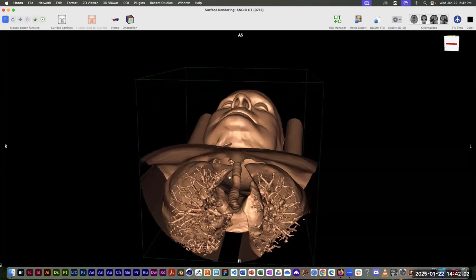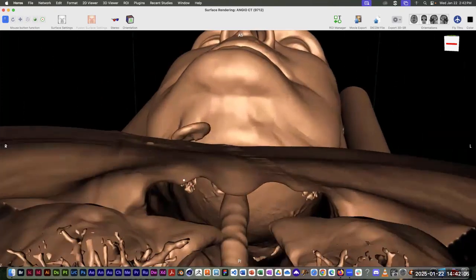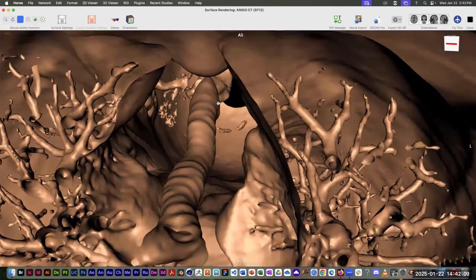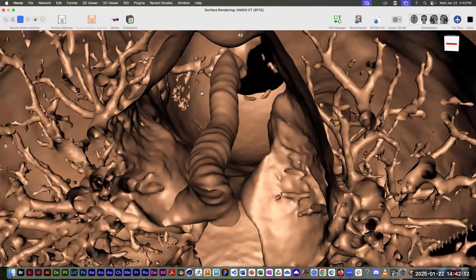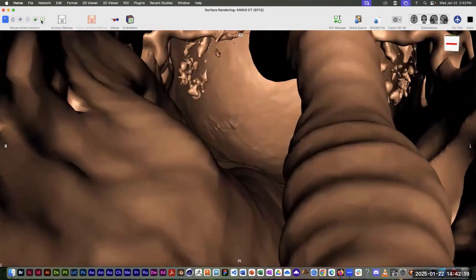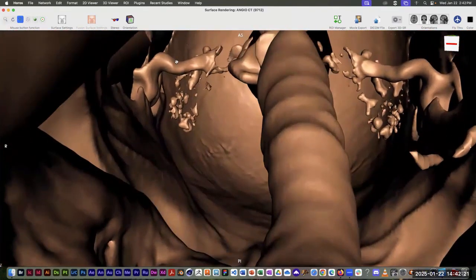And we can even zoom way in there. If you zoom in far enough, you can actually fly right into him and go up and even explore the inside of the pharynx and the larynx way up high. In fact, if you go way in there, you see the things off to the left and the right, that tubular looking thing on the left side and the right side of the image. That's the ear canal, the external auditory meatus, and the whole middle ear cavity, which again are also filled with air.